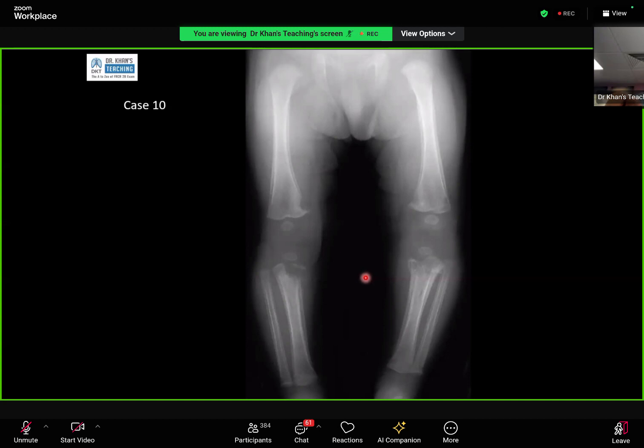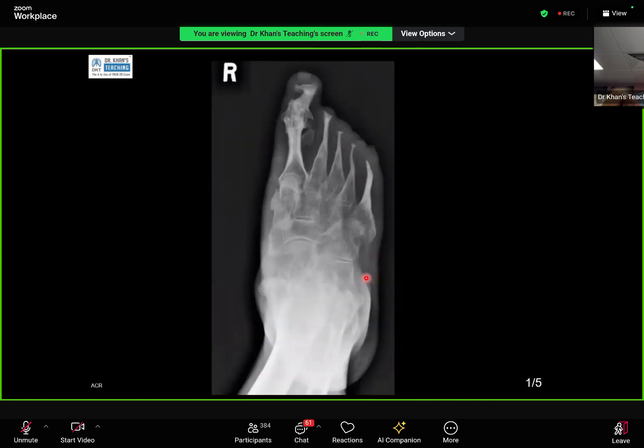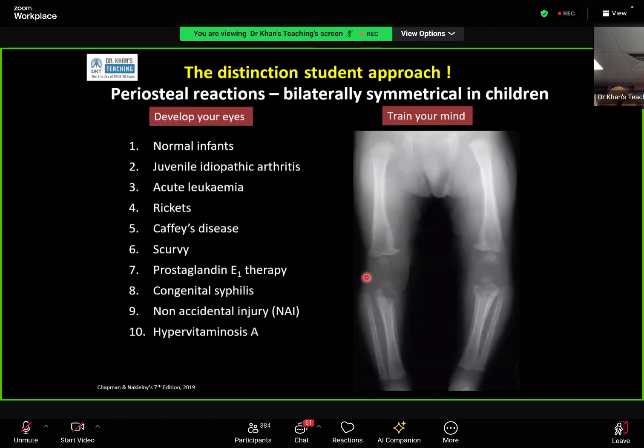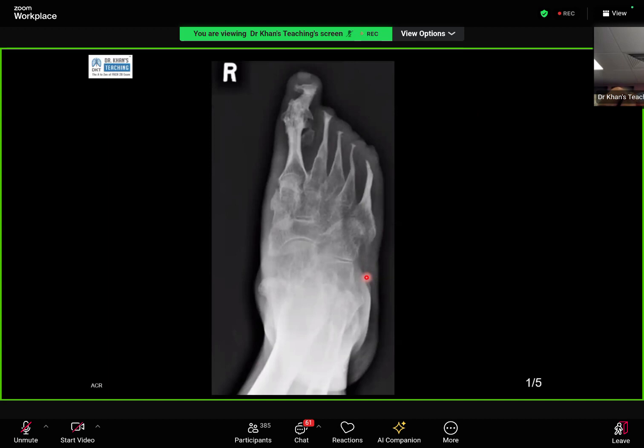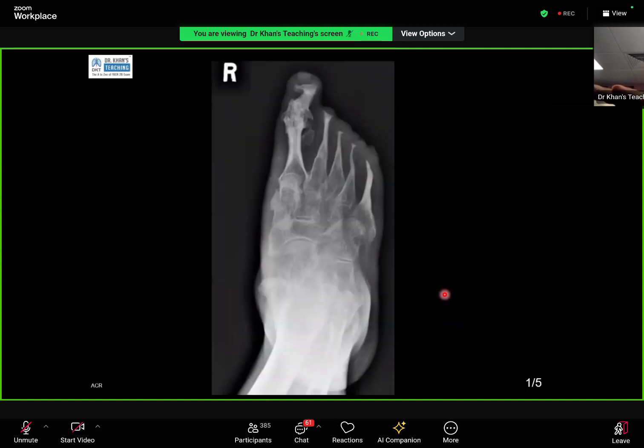End of story. And if the examiner grills you, you will stay firm. So this is congenital syphilis and nothing else. Okay, this was candidate number, sorry, I'm lost. 4. This 4, okay. So, madam, now you know how to deal with this? Yes, sir. Okay, well done.